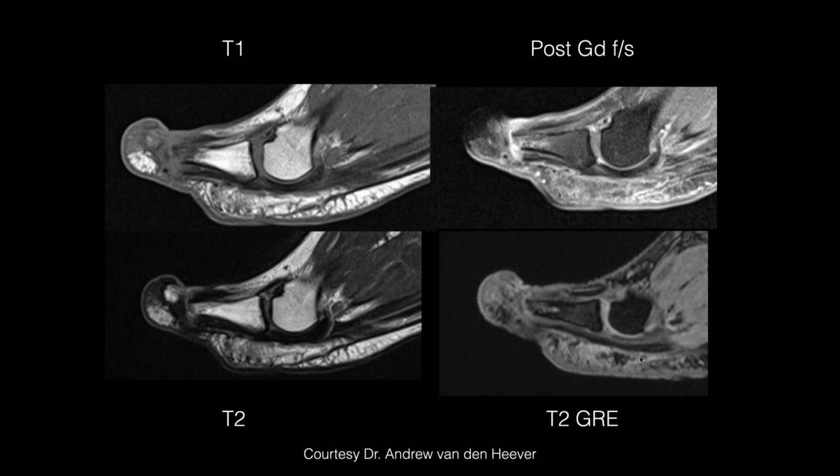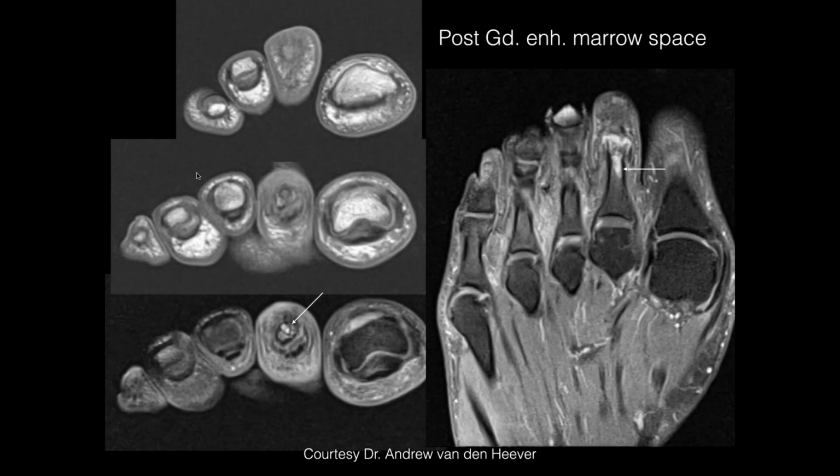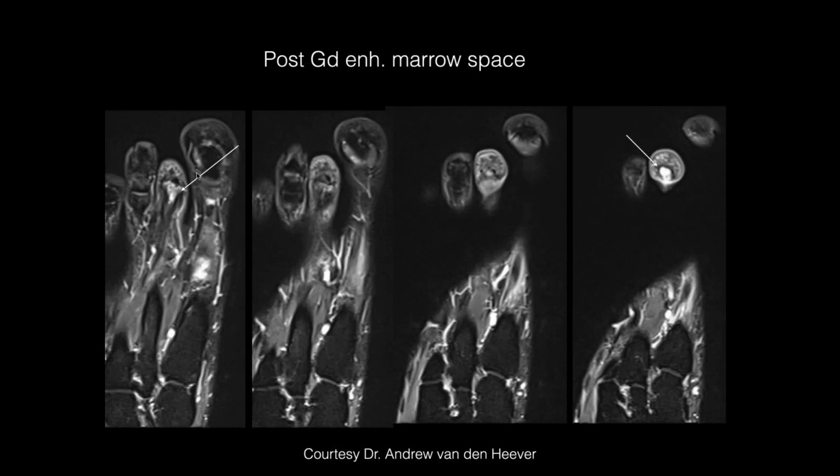A lot of calcifications, and it looks like there's a lot of, I don't know if that's a fracture or if that's just soft tissue osteitis of that phalanx, distal portion of the phalanx there. It's enhancing. I don't know if this is post-op. Could you get an infection? Oh yeah, they got a sepsis, right? They got a localized sepsis. Right. Yeah. So that's right.